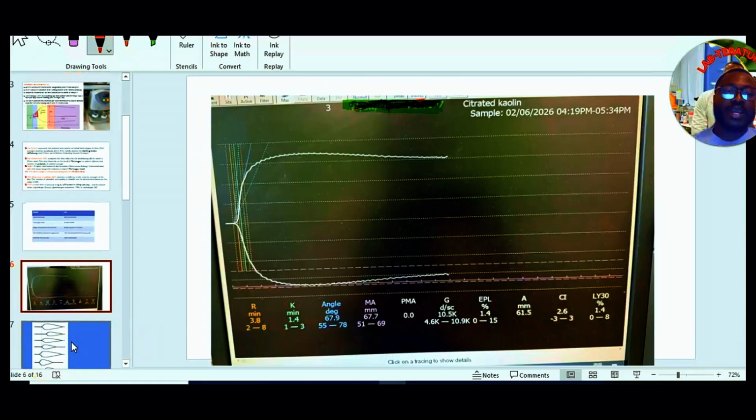I will launch a real time graph. This is a proper graph that has come from a test that was run with TEG, not a graphical deduction. This is real time. You can see there are vertical lines drawing from the bottom of the two sides of the diagram development. The diagram ended its R time at this point, if you are carefully seeing. When the reaction began, it started from here.